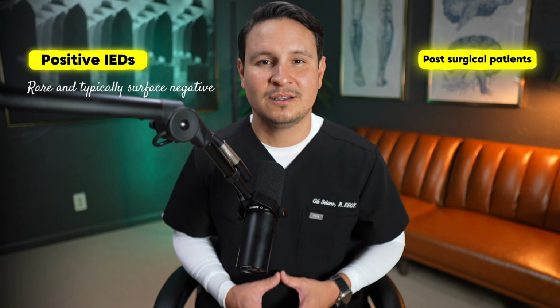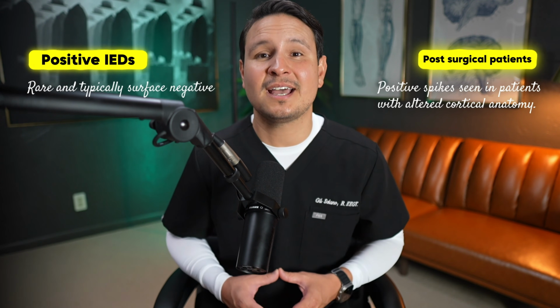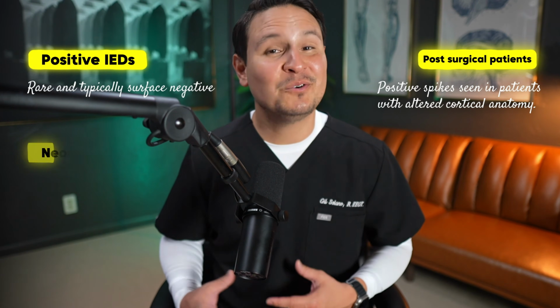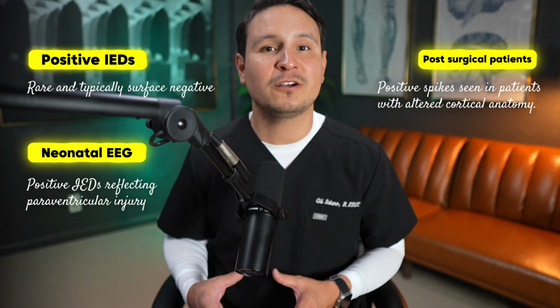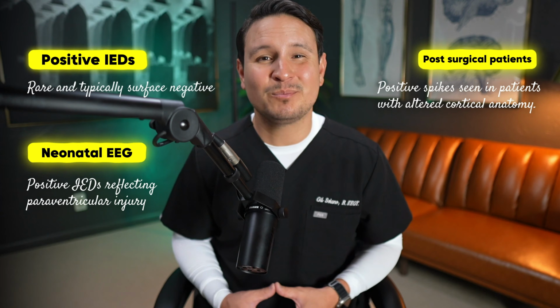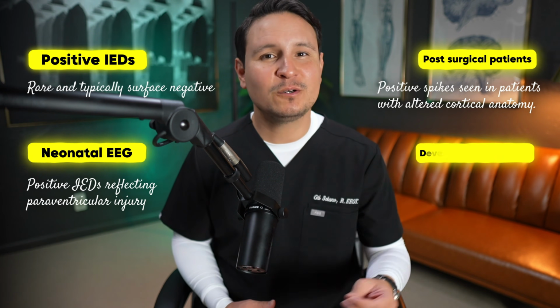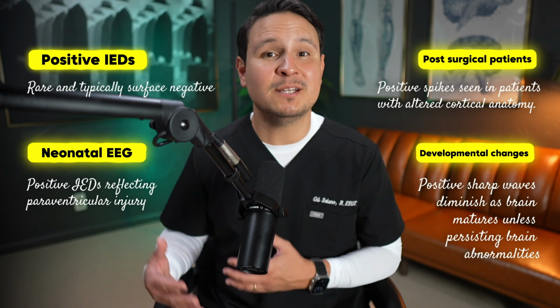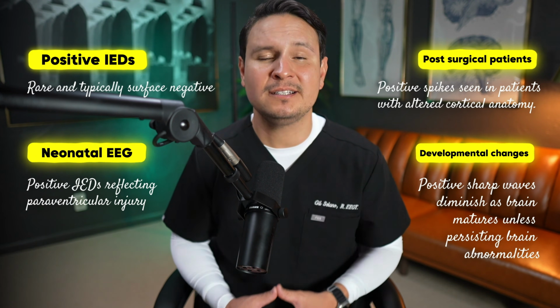Post-surgical patients. Positive spikes seen in patients with altered cortical anatomy, such as cortical dysplasia. Neonatal EEGs. Positive IEDs reflecting periventricular injury. Common in neonates, but rare in adults unless congenital malformations are present. Developmental changes. Positive sharp waves diminish as the brain matures unless significant brain abnormalities persist.